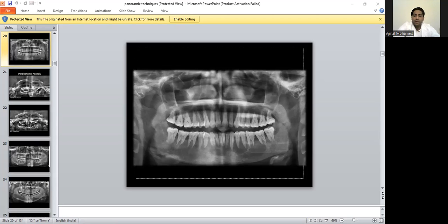The treatment for this patient was surgical. We removed the portion of the ankylosed bone in these two areas. This is the image after the surgical procedure. On the left side, this reduction area is the completely removed portion of the ankylosed bone, and here also we have slightly removed. When you compare this radiograph and this radiograph, you can find the differences.